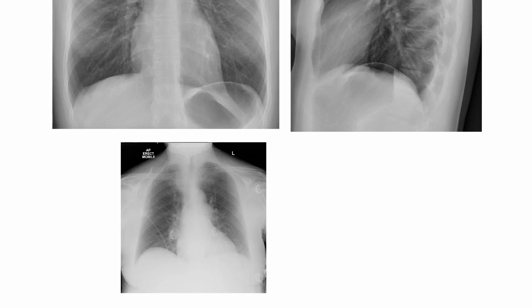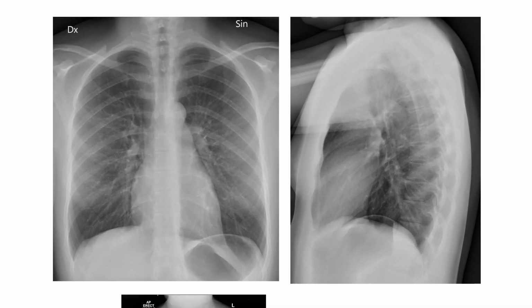Now, you can see here, this is a different kind of chest x-ray that looks similar to the PA view. This one is called the AP and is shot anterior to posterior. This is usually when you have someone who is too sick to leave your emergency department and they have to get the x-ray done in the department. And so it looks a little bit different, as you can see. It's not as clear a picture as the one on top, and we'll talk more about that.